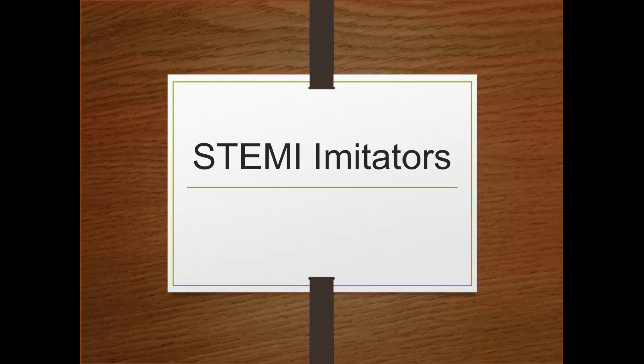So now let's talk about some funkier stuff. At first glance, you look at it and you're like, might be a STEMI. Might be ST elevation. Am I seeing ST segment elevation? I see ST segment elevation, but it's an imitator of a STEMI. We do have ST elevation, but it's not an MI. So let's talk about some imitators of STEMIs so that we're not calling a code STEMI on something completely different.